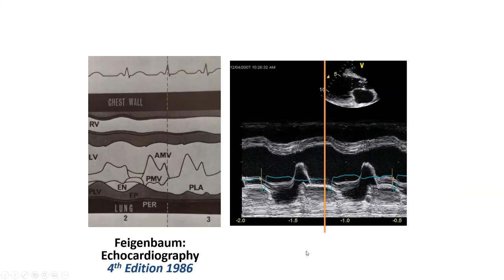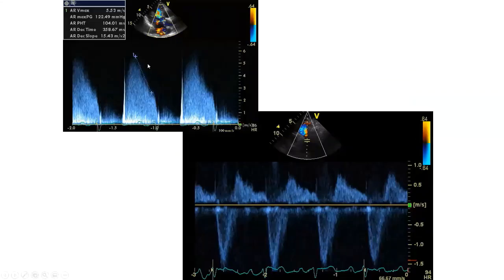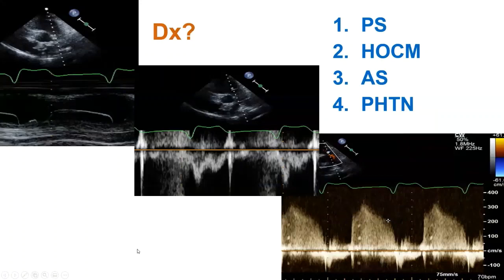And this is so-called early closure of the mitral valve, which is indicative of acute severe aortic regurgitation in someone who more often than not has staph endocarditis of the aortic valve. Here's another example of a very, we joke and call this sloppacious aortic regurgitation jet in somebody with bacterial endocarditis.